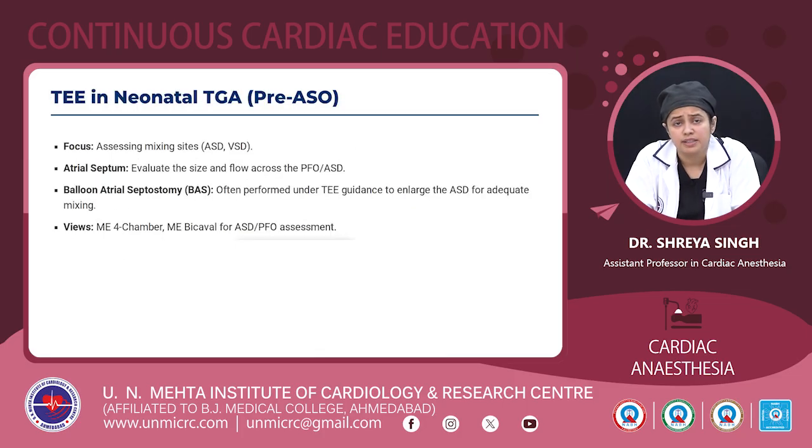So TEE in neonatal TGA before the arterial switch operation. We focus on the mixing sites, that is the ASD or the VSD. We look at the atrial septum, evaluate the size and flow across the PFO or ASD. A balloon atrial septostomy can be performed under TEE guidance to enlarge the ASD for adequate mixing. The usual view is the mid-esophageal four-chamber and mid-esophageal bicaval view for ASD or PFO assessment.